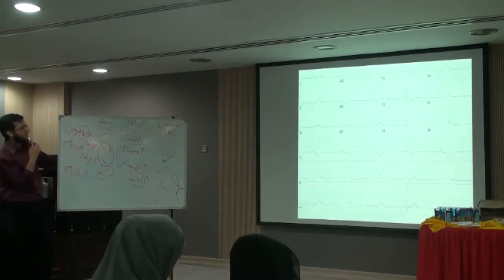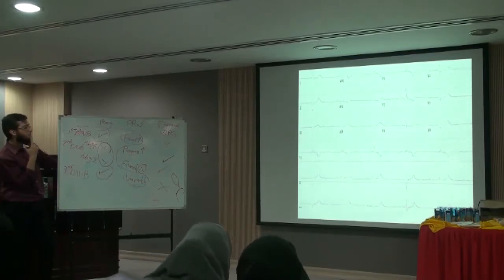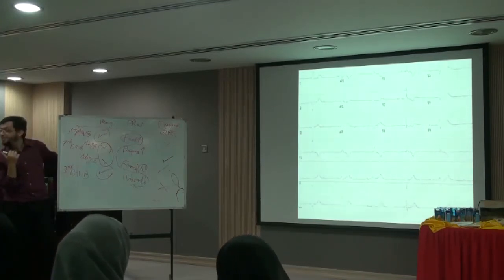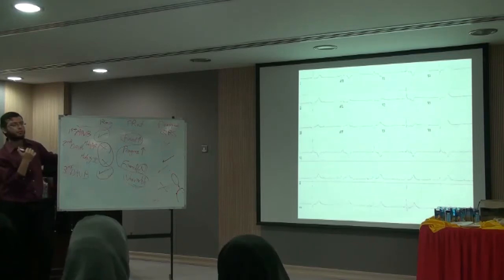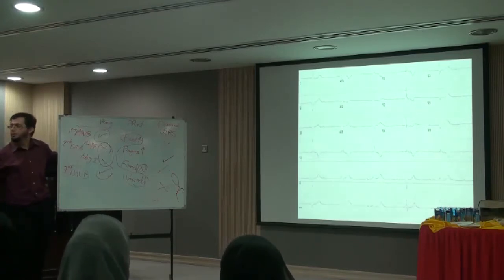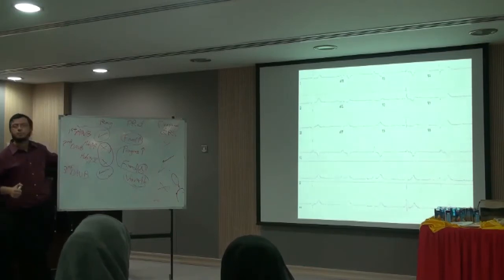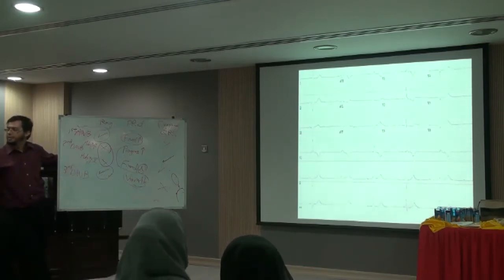Okay, what about this? Regular. So it is regular, and it is on the brady side. Can it be second degree AV block?